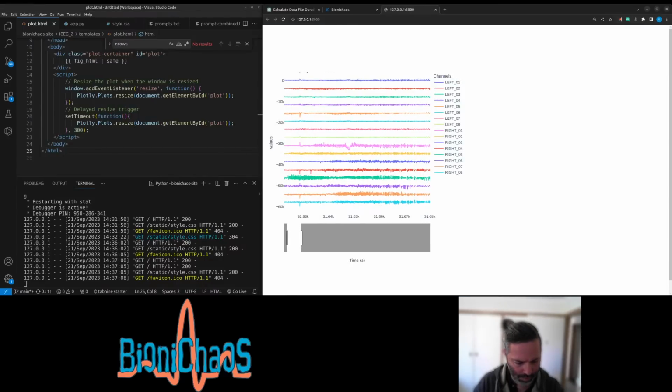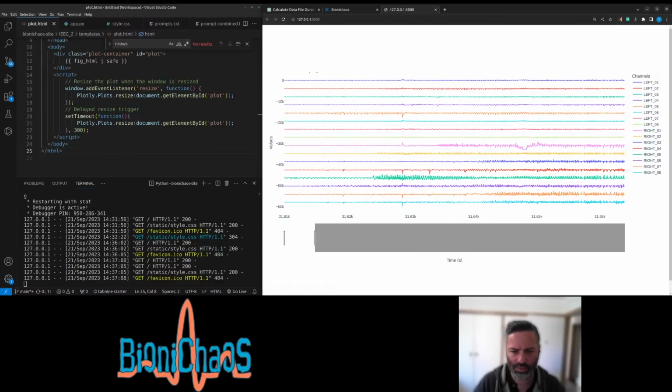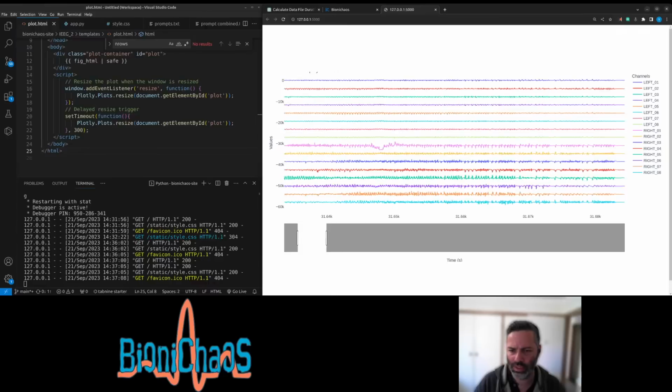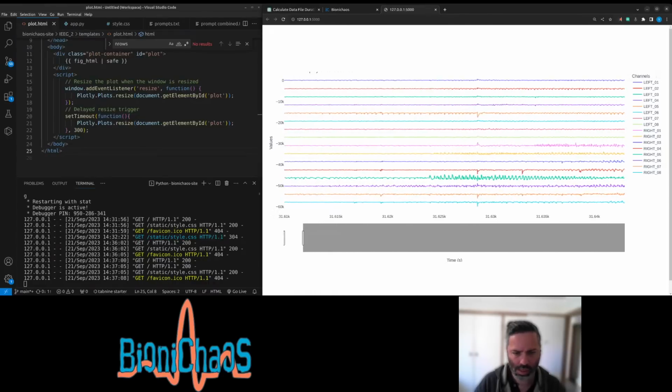Anyway, but that's what the tool does look like so far. We have a seizure starting on the right. I think it's staying mainly on the right side of the brain.